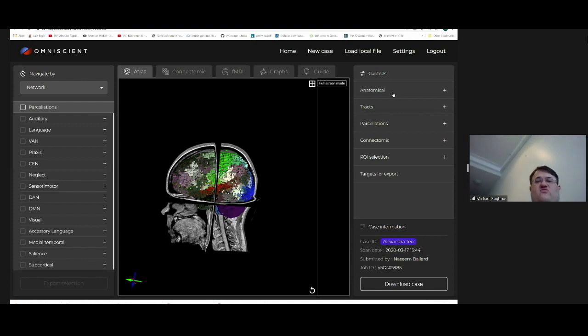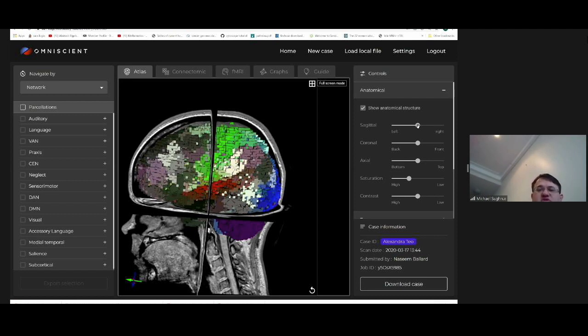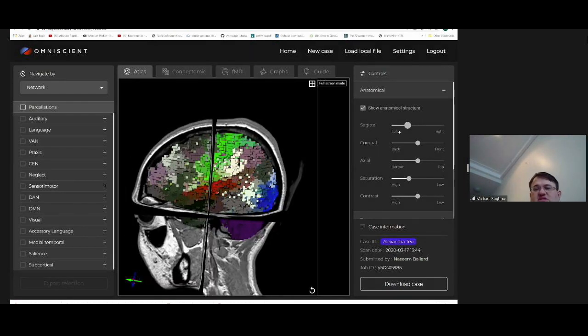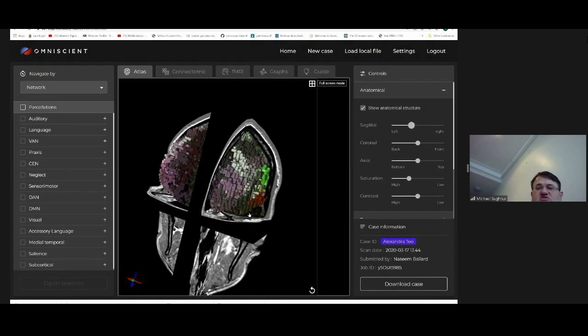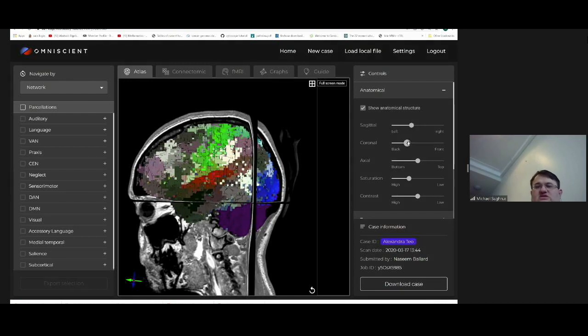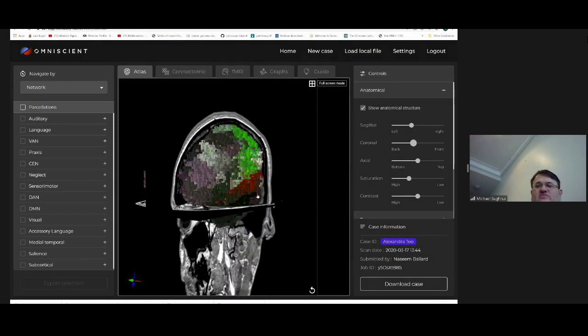So to quickly run you through the right side panel, because this is probably the first one to understand. And for those of you who are not extremely familiar with working with three-dimensional renderings, these are the traditional three-plane orthogonal 2D image views that are all linked together. So for example, as I work with sagittal, you see that things start to disappear into the page as they reach the plane that they're located in. It's important to note that that's going to always cause a challenge with parallax, so just be aware of that if you haven't worked with this before. And you can see we have different views that allow us to really more precisely determine the position in space.